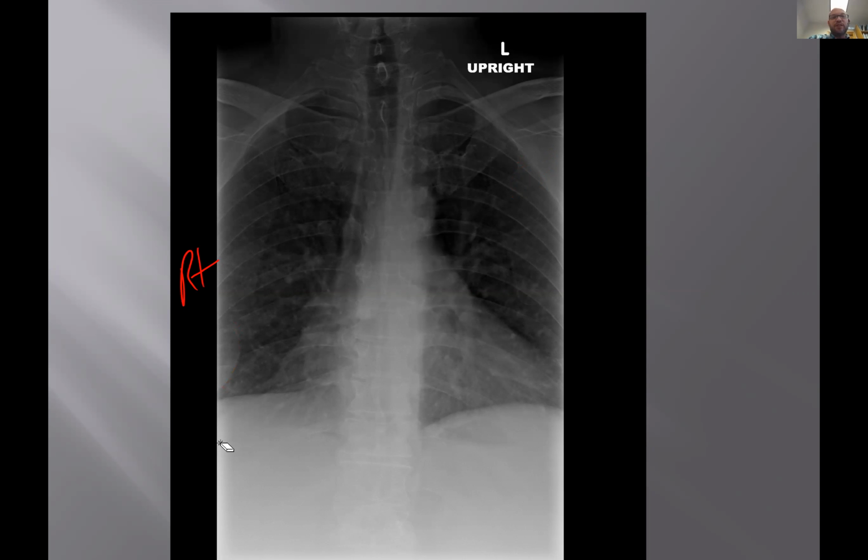Now, some of you said this looks a little sclerotic right there as well. I think I might buy that. This is the main finding. You say, well, that's hard. Well, yeah, that is hard, but it just came through. And so that's the finding. And what's the next best follow-up to this, in my opinion? You can say what you want to say. I'm pretty sure I know the right answer here. What do you think?